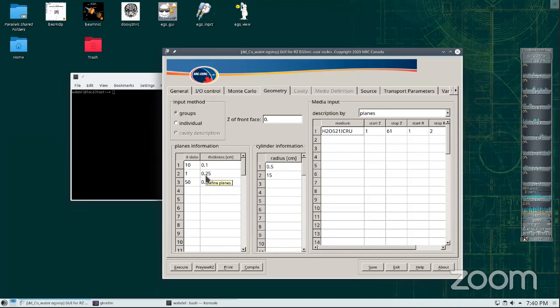I purposely did that because in the build-up region, or Dmax, we have a large gradient there. It's the same concept: can you use a large chamber to measure in the build-up region? Probably not. You probably need a smaller chamber, or even a parallel chamber. Now, after those 10, I put one slab with 0.25. I made it just for convenience, to tell you the truth.